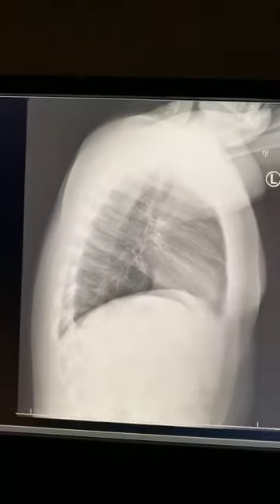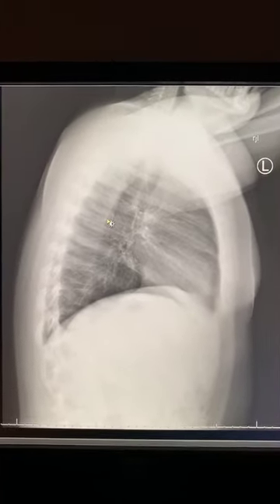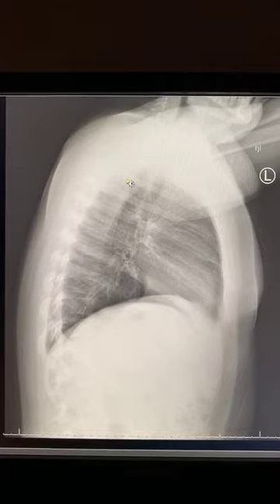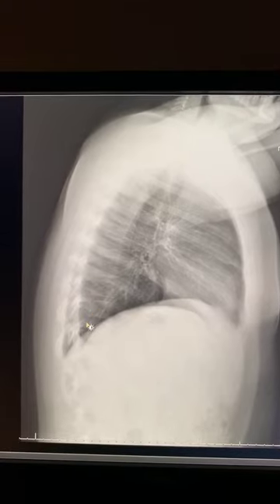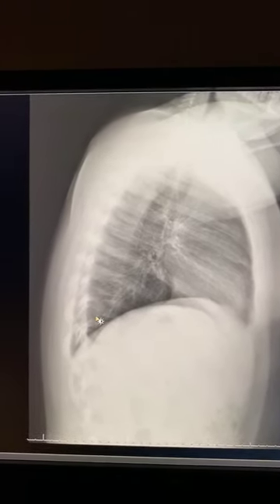So you go to the lateral view here. Now check it out. We'll go over all the lobes and everything. I got my presentation all geared up, ready to go for you guys. But this right here is normal. You want a nice white spine up here, and then as you go lower, lower, lower, it should get darker and darker. Now tell me, you already know this patient was rotated on the AP view.